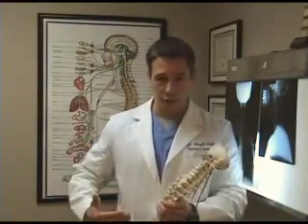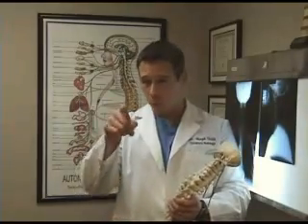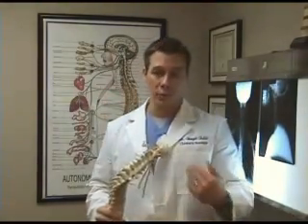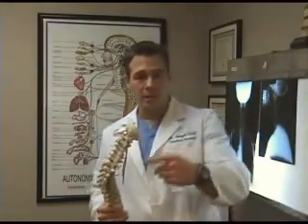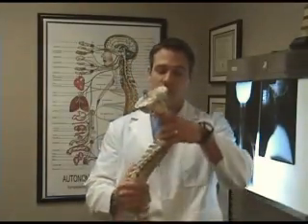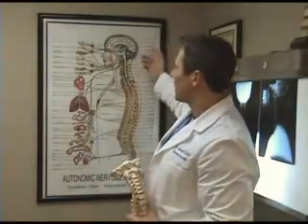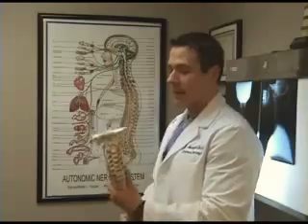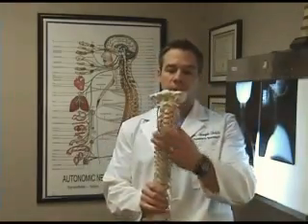and we're going to go over specific x-rays so you can really understand when you come back and you look at your own x-rays, you're going to be able to point right out and say, oh, Dr. Childs or Dr. Durr, I see where and the reason why I have this problem. I can see that my discs are degenerating in this area. Okay? So again, the spine should have three curves from the side, and you can look at it right here. It's in every anatomy book. You should have a curve in the neck, a curve in the mid-back, and a curve in the lower back, and the spine should be nice and straight from the front.